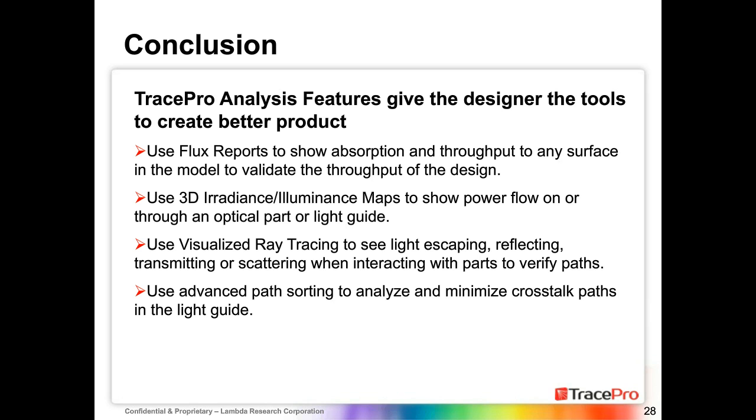Finally, you get to see rays tracing from the LEDs through the system to the photodiode. That gives you a lot of information on where you're losing power. You're seeing if you're actually getting the bulk scattering that you expect. You get to hopefully see that banana trajectory that you expect to see there. And if you have external stray light sources or stray light inside the mechanism, you can see that occurring with this visualized ray tracing.